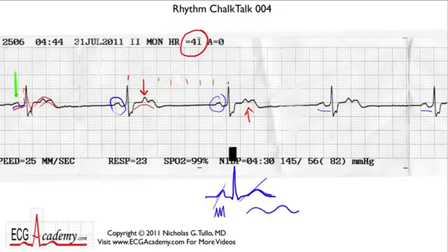And if you take this P wave and you take the next P wave and you measure halfway in between, indeed there is nothing there. And so you might say, well, there's no P wave here, but maybe we got the P wave rate wrong. So let's measure from this P wave to this one. Where would the next one fall if that was the atrial rate? Well, it would fall in here someplace, and then maybe have another one over here.